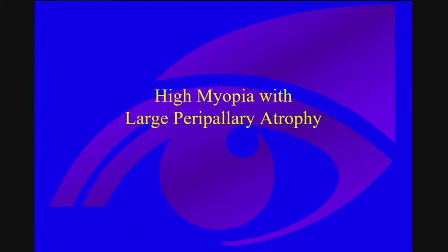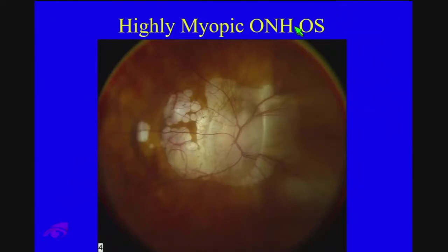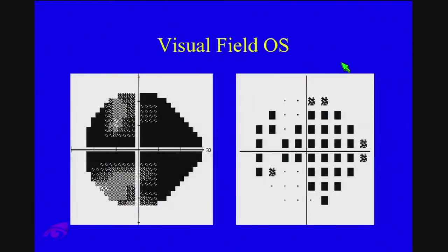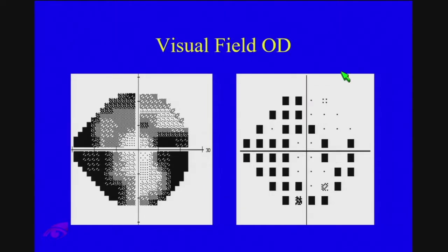And with regard to the eye, there are going to be those situations like this, where this is a patient with high myopia. You can't even tell where the disc border is. There's a ring here, there's another ring here, it's all tilted, and there's all this loss of nerve tissue. Same thing here. This is what we dreamed OCT would tell us, right? You know, you can't figure out what's going on with this nerve and if it's getting any worse, but here's the problem. Bad visual field taker, high myope, bad visual fields.